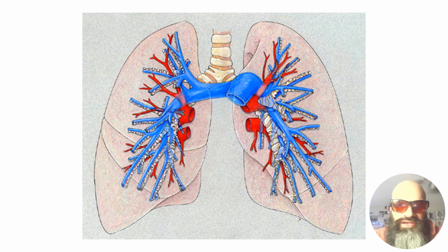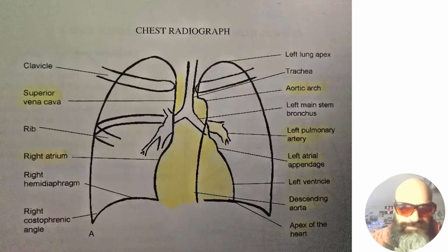Now, with disease pathology, we have the capability of seeing these things due to plaques or calcification buildups or certain fluid densities that could accumulate within the normal lung parenchyma and bronchi.